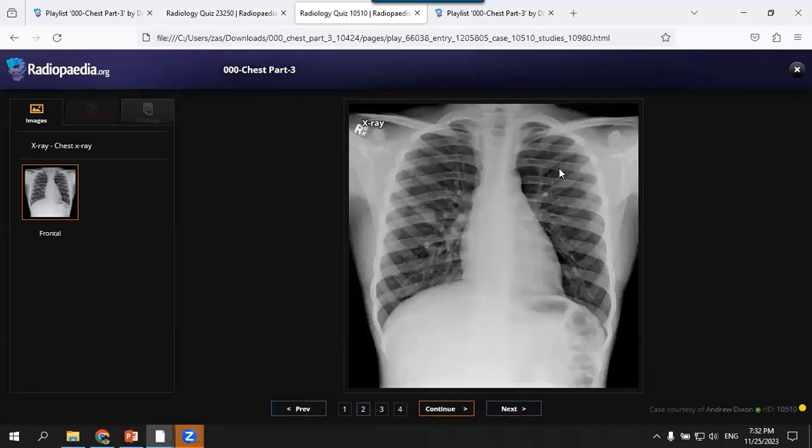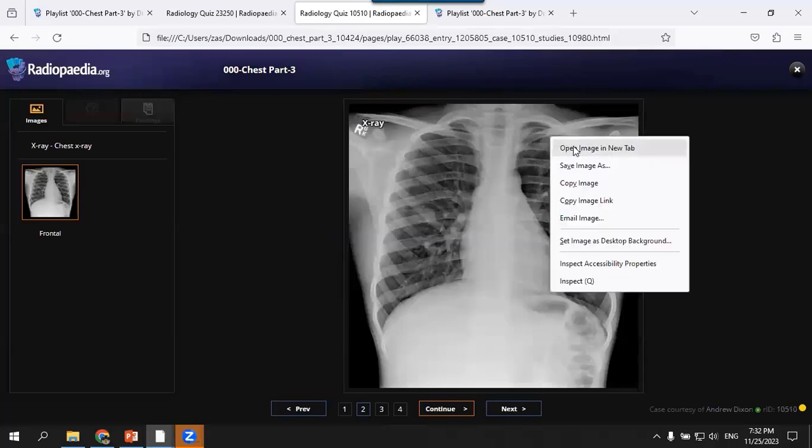Okay, the last case for you, the same category. Can you comment?